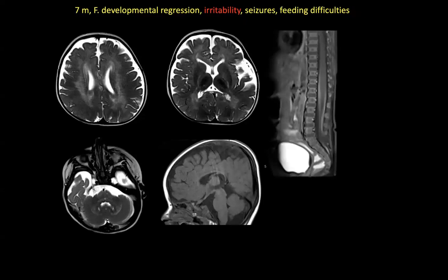Let's stay in the world of the leukodystrophy. And another constellation of findings for you guys is in the context of irritability, 7 months. Again, look at the white matter. In this case, it's not just faintly hyperintense in T2. It's definitely hyperintense with some sort of striate pattern, which we called tigroid before. Also involvement of the posterior fossa, but do not stop here. The thalami are quite dark in T2. The optic nerves are quite thick, and you have enhancement of the cauda equina.